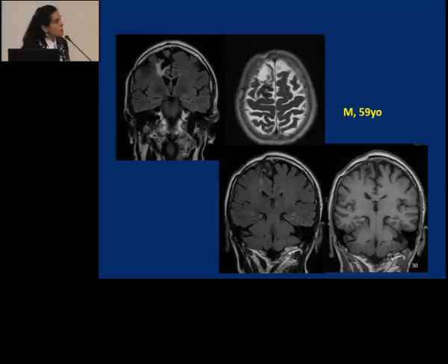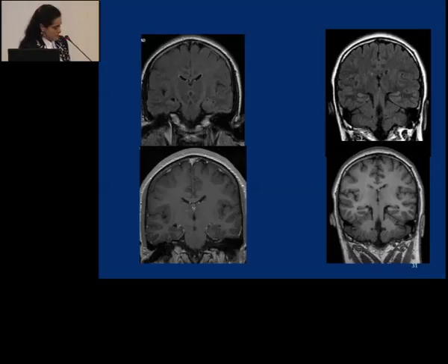Okay, so this was the operation before, of this cavernoma, and they claim that they removed it. They show me the histology, but I see that this is still here. Because there was a worsening in the course of the epilepsy of this patient, I had to perform this follow-up. And these are 2 different cases.